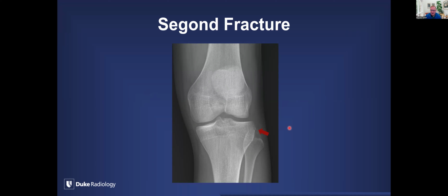I think the leading theory right now is that it's part of the iliotibial band that pulls off that bone, but it's frequently associated with an anterior cruciate ligament injury. So we see that little tiny avulsion fracture at the lateral aspect of the proximal tibia. We know it's a Segond fracture, and we know there's a likelihood that there's a post-traumatic ACL injury. At least in our country, we'll move on to MR. These are frequently associated with pretty big joint effusions.